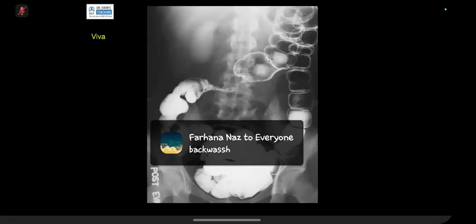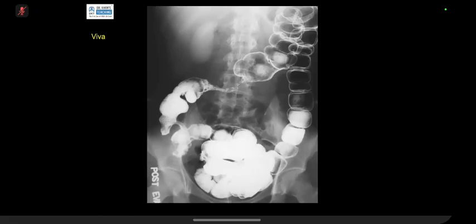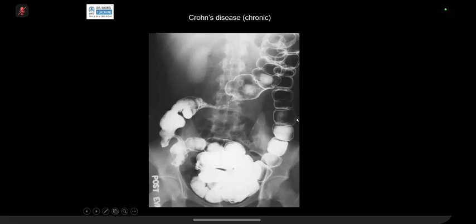And this is the same thing, more chronic. It is fibrosed, isn't it? And it is quiescent. You don't see anything very acute there. And it is absolutely fibrosed. So this just tells you the spectrum and the clinical spectrum.